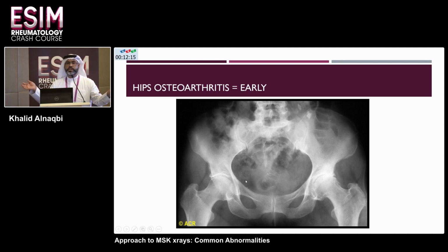Same teaching for medical students. 4 cardinal signs of osteoarthritis. Narrowing of the joint space, subchondral sclerosis, subchondral cyst. And because of the cyst, it becomes some like vacuums in there. And then finally the osteophytes. So 4 cardinal, same issue.